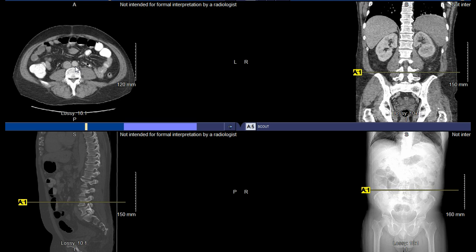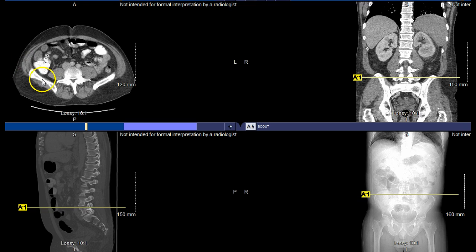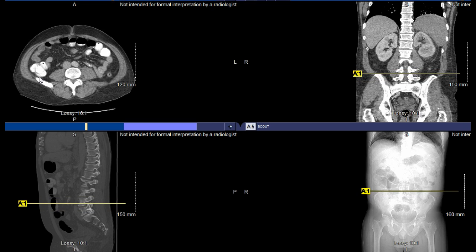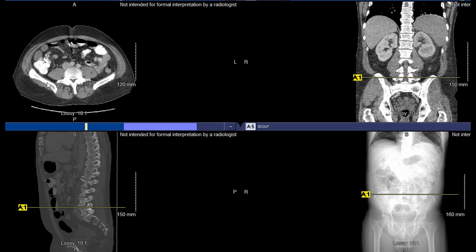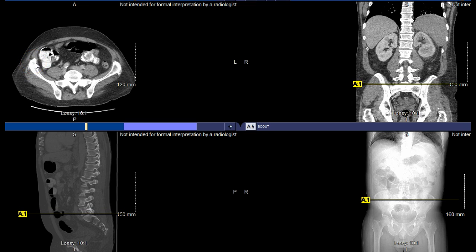So that's the first thing to note. That's right around the region of the pelvis. You can see the pelvic bones being demonstrated here. You can think about the first pelvic bones that you see as being equivalent to the iliac crest, the most superior portion of the pelvis itself. You can see those regions here. And additionally, you can see those regions associated with the anterior superior iliac spine, the ASIS, versus the PSIS there, and also the formation of the SI joints on both sides of that sacrum that is present there.